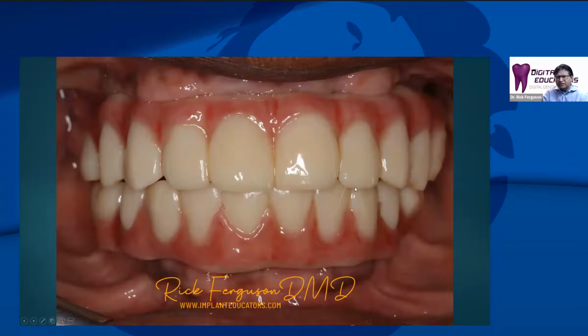Okay, but that was how we were using the face scan to help with the design of the final prosthetics, and being able to look at it from different angles, from above the patient's teeth, below the patient's teeth, et cetera. That really helps us refine the tooth placement, the incisal edges and such.